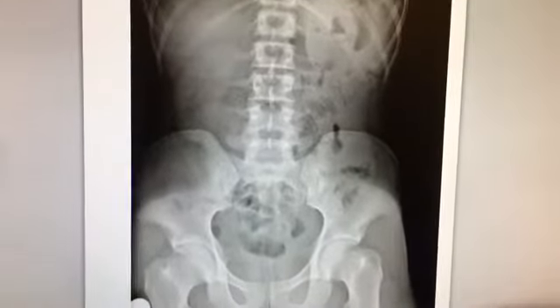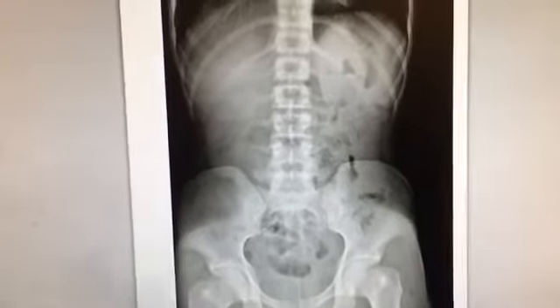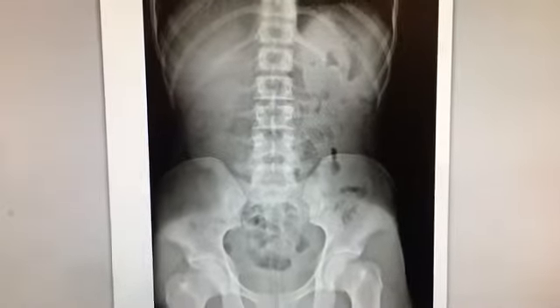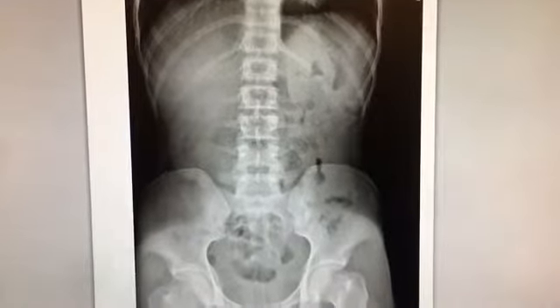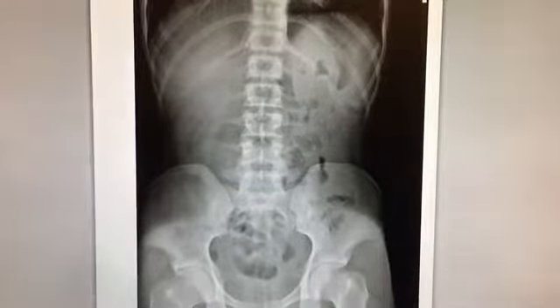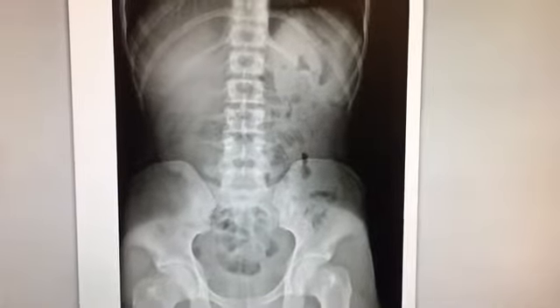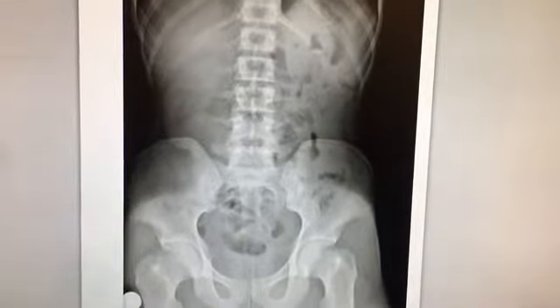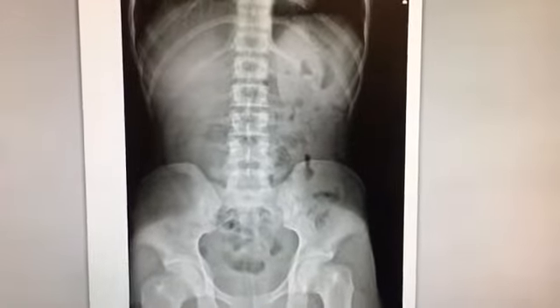Now we will move on to the image evaluation portion of the BE trigger. Before any barium enema, you want to take a standard AP or PA KUB before tipping the patient and putting the contrast into their body. You want to make sure that all fecal matter has been voided from their system, because any excess fecal matter could appear to be a polyp and give a false positive. So we want to make sure their entire system is clear.